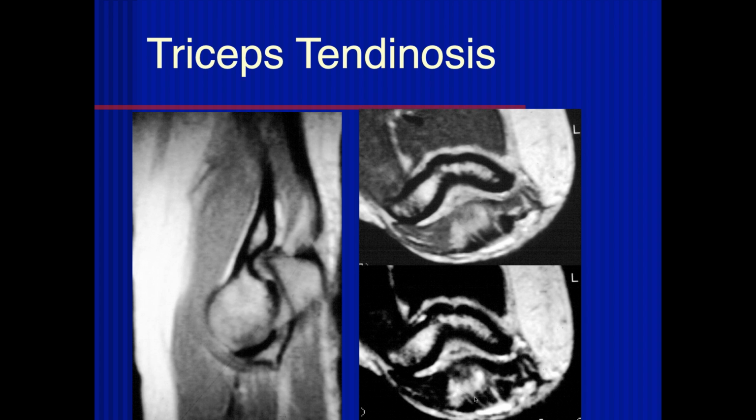If this high signal here goes all the way through, that's fine. But to have confluence like this, where you break up the longitudinal low signal regions, is abnormal. And this patient had chronic symptoms from really chronic partial tearing with granulation tissue and attempt to heal it, a thing that we just call tendinosis. Right. Okay.